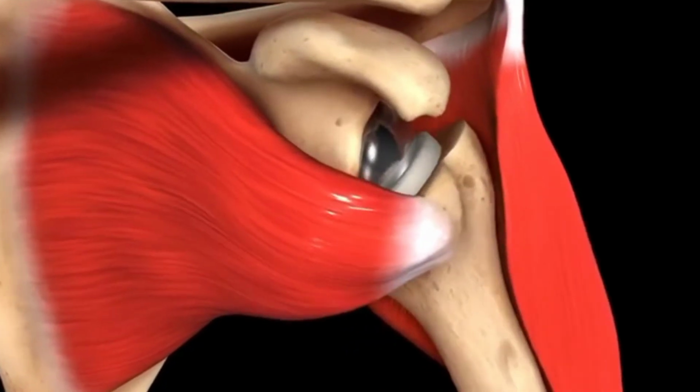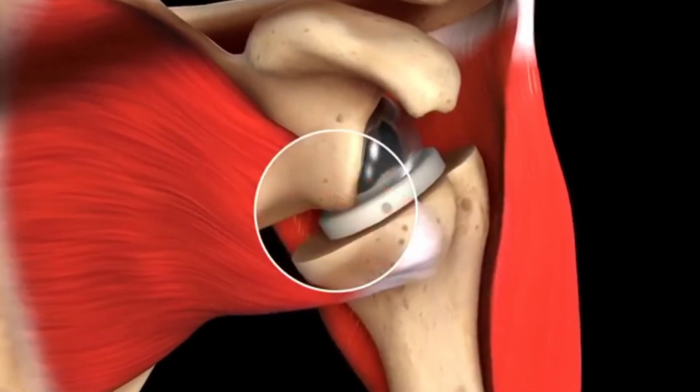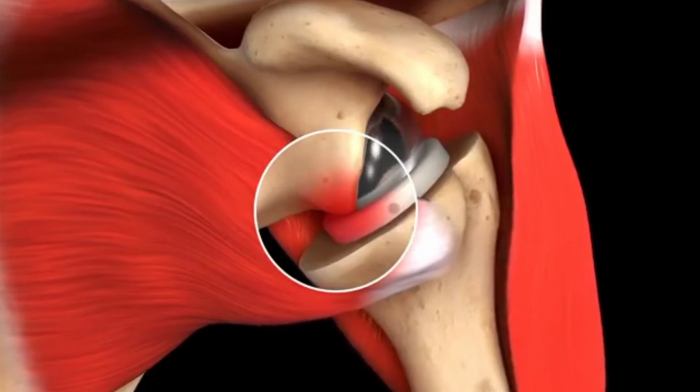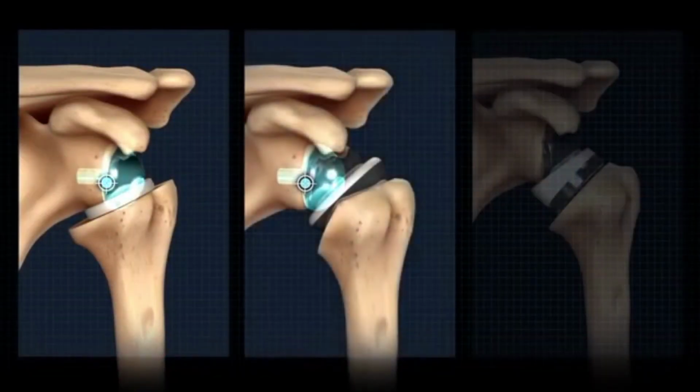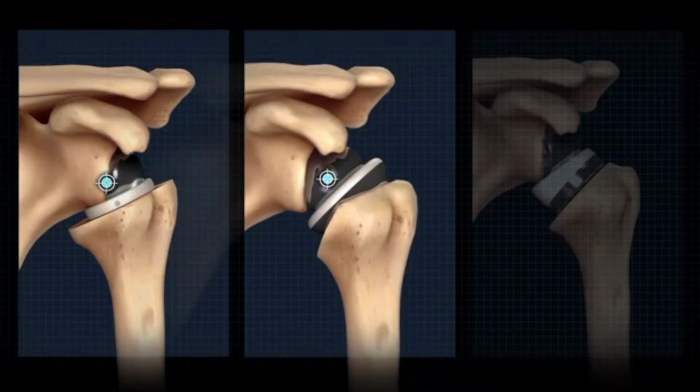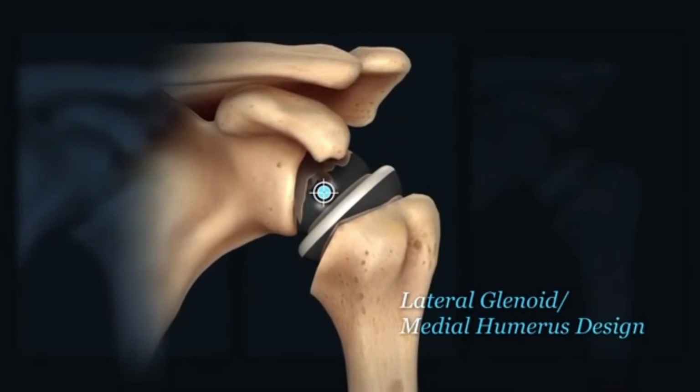Grammont's medial positioning is also responsible for a low glenoid loosening rate, but a high scapular notching rate. Prosthesis designs that lateralize the center of rotation relative to the Grammont may improve active rotation, strength, and stability, and also reduce the scapular notching rate.